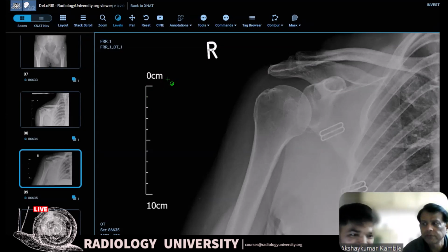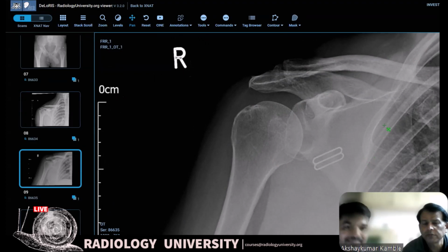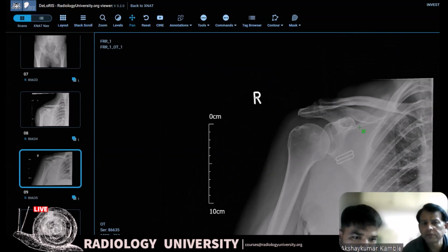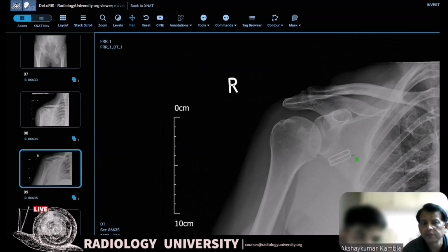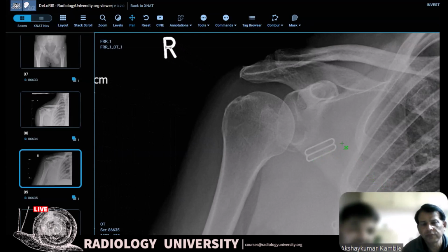This is a frontal radiograph of the right shoulder. I see some foreign material, probably resembling some external fixation devices. I also noticed there's a bony defect. You mean these clips? I suspect they are patient artifacts. They are not, the patient is on an arm sling.